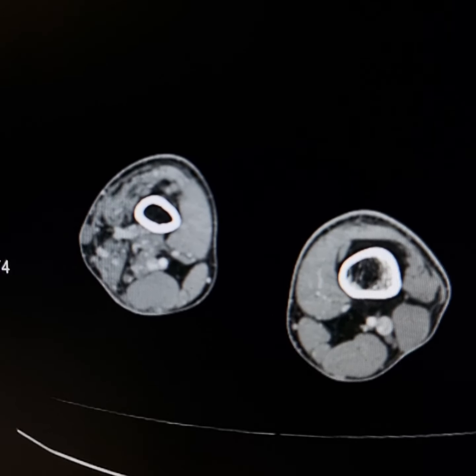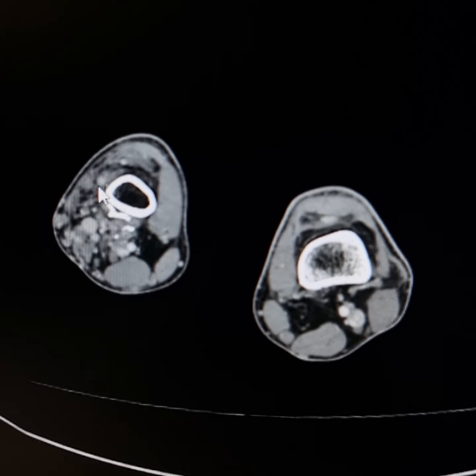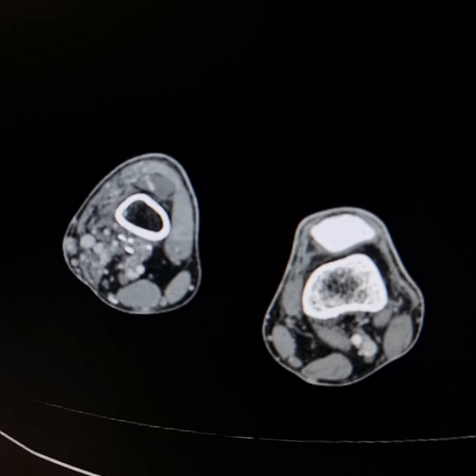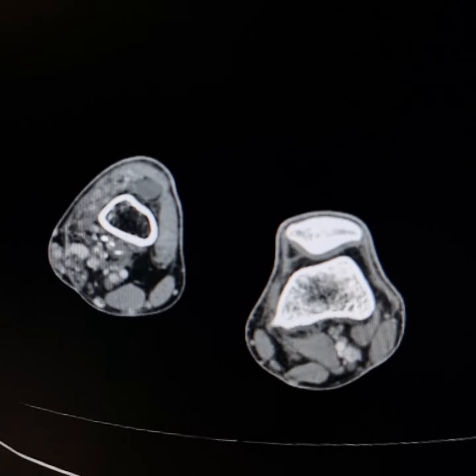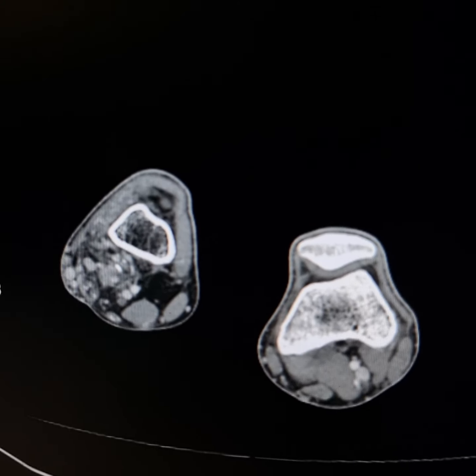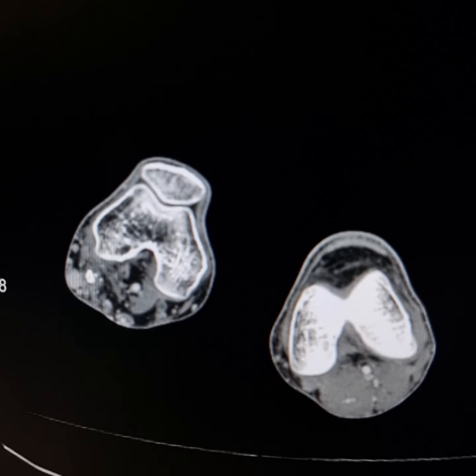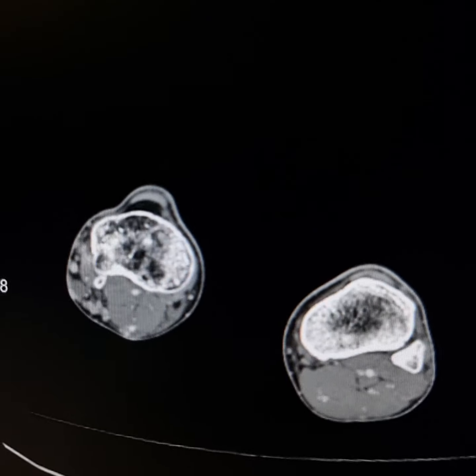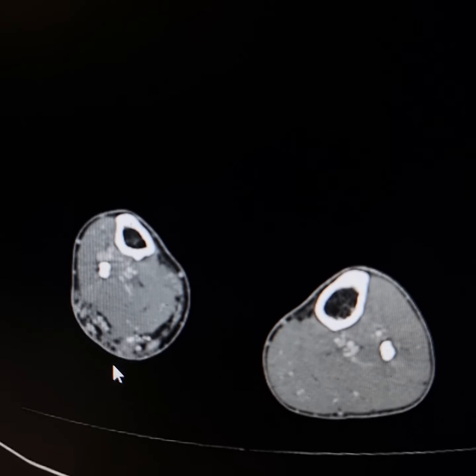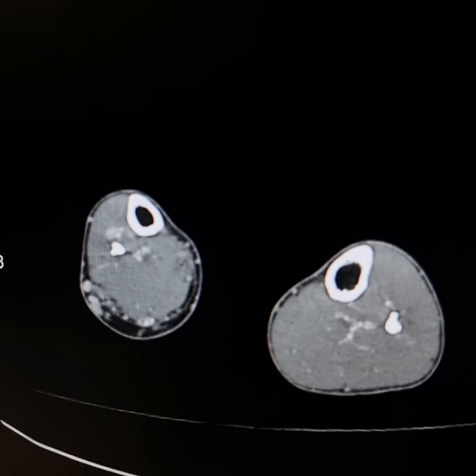Now this is another venous hemangioma. Please observe atrophic vastus intermedius muscle, vastus lateralis muscle, long head of biceps femoris, semitendinosus muscle. Now this extends downwards into the popliteal fossa along the lateral surface of the knee. Please observe varicose veins. Short saphenous vein is thrombosed because of sclerotherapy.